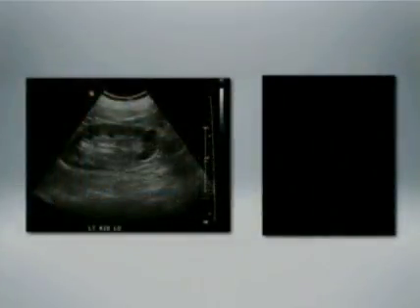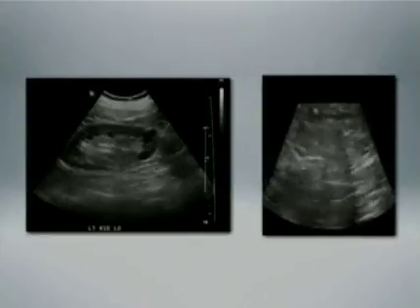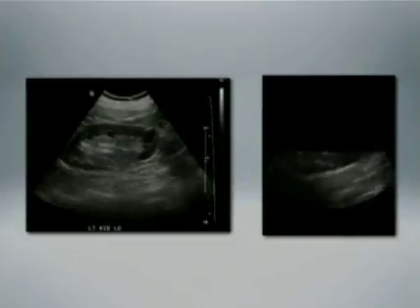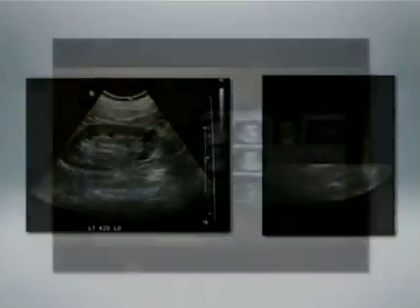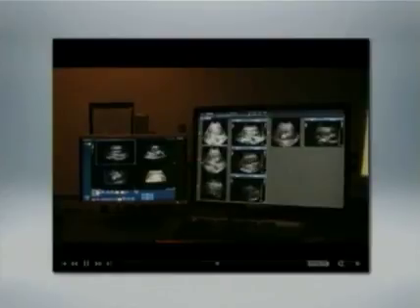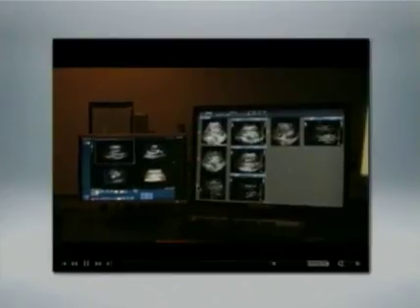This is a shot of the left kidney, just a static image showing some complex cysts at the lower pole. And on the workstation, it's from a company called iMorgan, which is the vendor of our ultrasound PACS. The volumes look like that. And they look a little bit different from the way clips ordinarily do, and this mimics the way the volume was acquired. More importantly, if you look carefully here, you can see on this workstation, some of these acquisitions have a little box next to them.